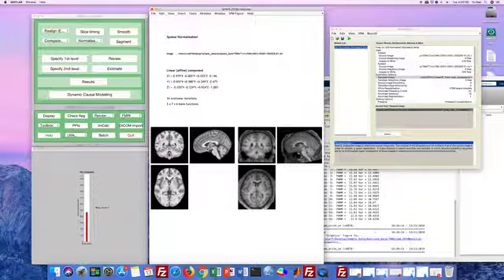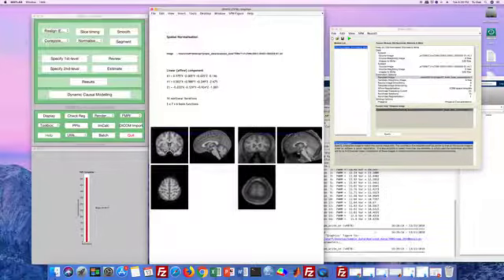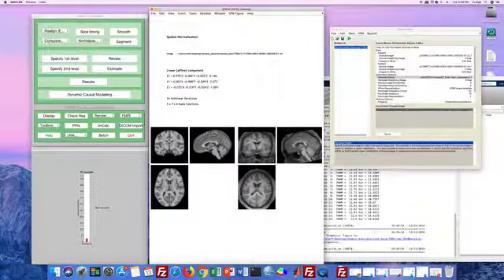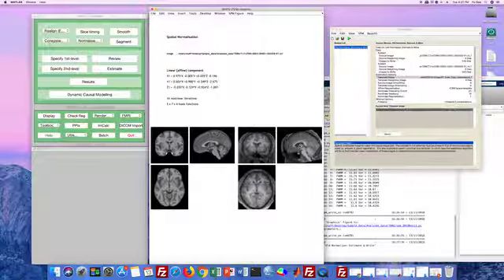So here, to make our image look similar to the template, you can move your cursor around to make sure whether you have any problem.